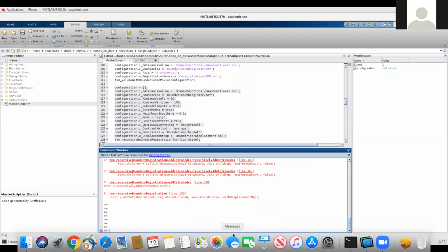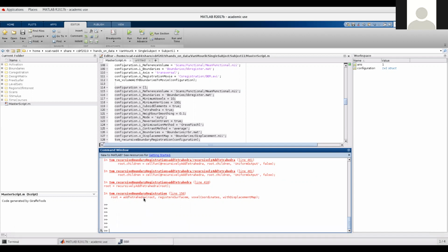Anyway, that is just a way of solving the registration problem. There are downsides to this. It doesn't always work. You might need to fiddle with the settings a little bit, but that's one of the take-home messages of this course, if it's up to me. Layer analysis is very detailed, and that means that settings for one subject might not be the best settings for the next subject. Therefore, I really like to have many of these little movie files and sanity checks here and there in between to continuously probe, like, is it correct what I'm doing, right?